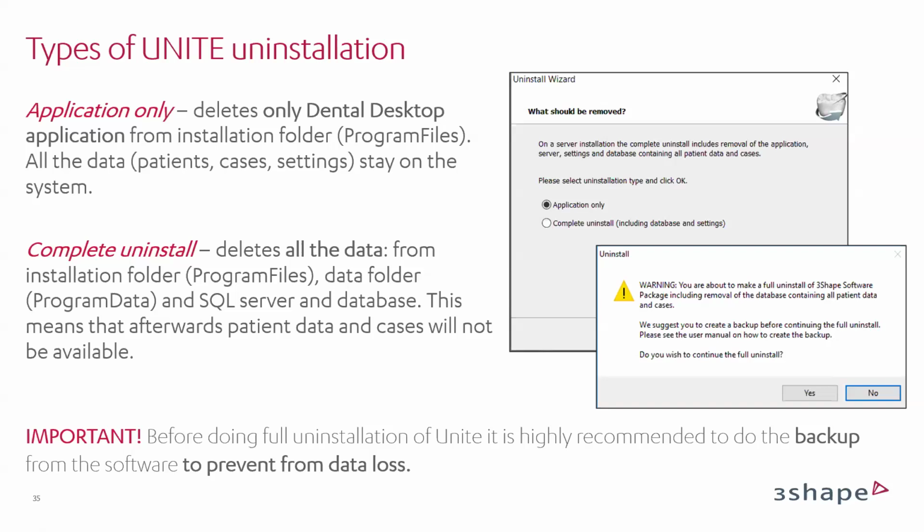But we should also take into consideration the fact that before doing the full uninstallation of Unite, it's highly recommended to do the data backup from the software to prevent data loss, of course.